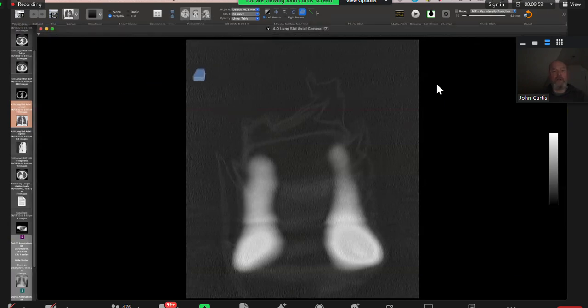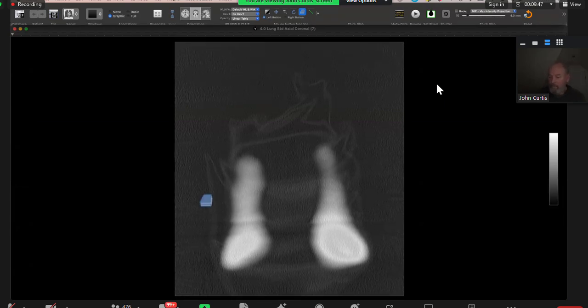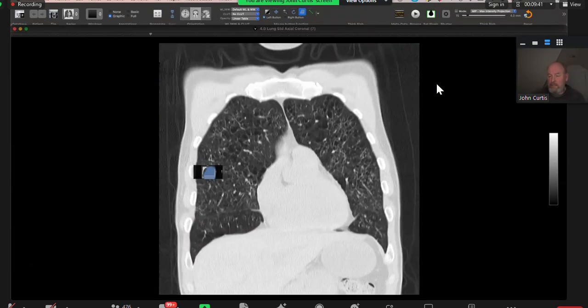Okay, have a look at that one. Should I scroll or are you going to do it? Please scroll, yeah, please do. Just move it up and down. That's it. That should work.